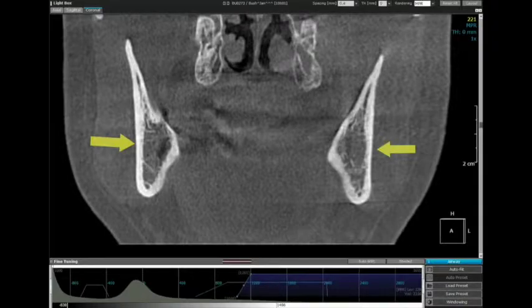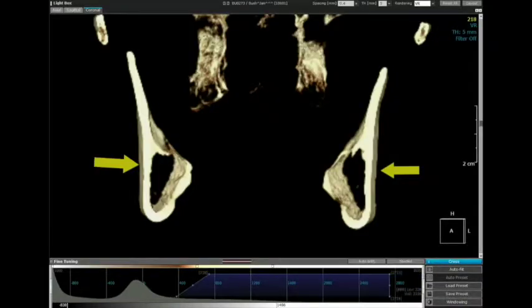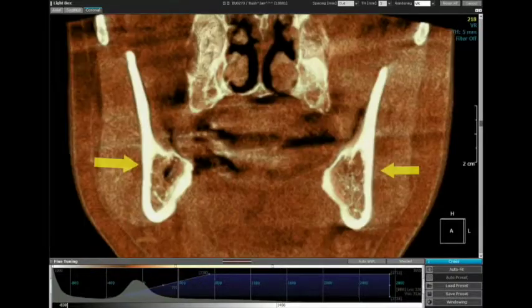Where I go is I go to court sometimes after somebody's gone in with a surgical drill. And if you see, you know, these are 3D surface renderings, slab renderings at about 5 millimeter thickness. I can put the soft tissue back in there, but only very marginally. So I can do that, and you can see that this side looks like there's something more going on than this side. By the way, that's the inferior alveolar nerve canal, and this is part of it here. Is that a cavitation? I don't know.